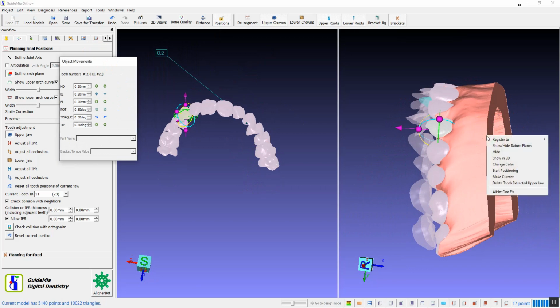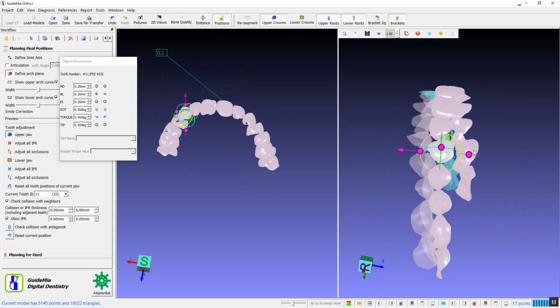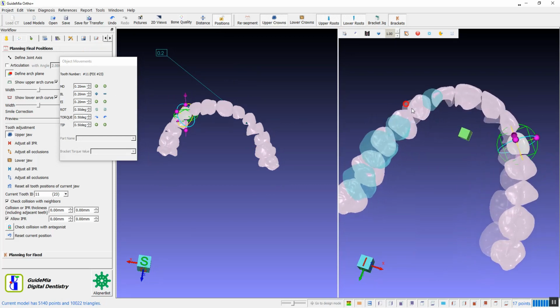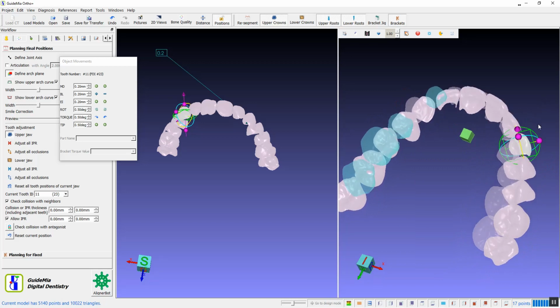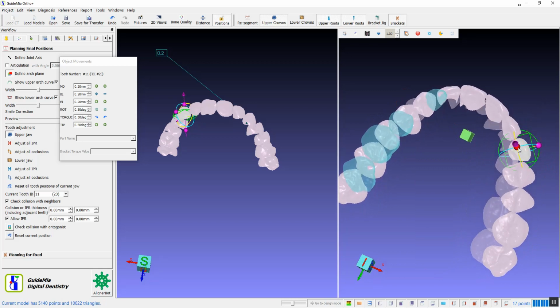If we hide the tissue model, we can see the virtual rotation center of the tooth. According to the actual situation, the center can be moved along the axis. If a handle is dragged, the tooth will be rotated about the center. If we simply pick the tooth, the rotation is done around the geometry center of the tooth. This is for placement only, not really for the stepping plan later.